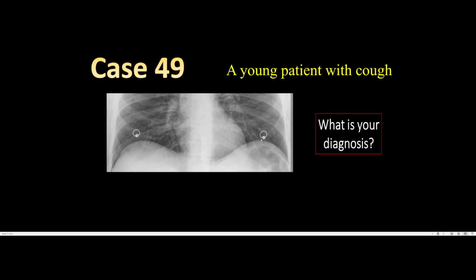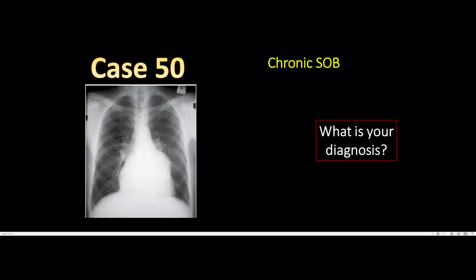And again, anything of metallic structure will appear as very white. They will appear as very dense in a chest X-ray. So we just want to mention that this patient has piercing because this chest X-ray is not complete, all right? We just want to say that this patient has piercing and nothing else besides that. We can see that the costophrenic angles are normal, the diaphragm is normal, the lung parenchyma from this incomplete picture is completely normal. Now for the final case, or almost the final cases.